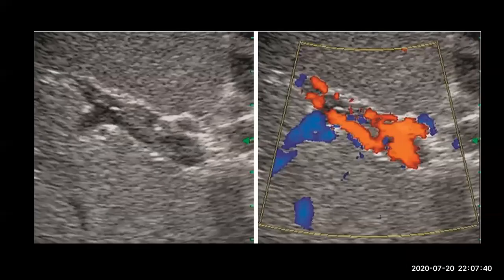This is abnormal regarding the first one. What we see here is thrombus inside the portal vein. Look carefully. Is it cavernous transformation, or do you see something else? This is the portal vein here, and it looks expanded, and there is some flow inside it, and some area with no flow. So what is this area here? Thrombus. Okay.